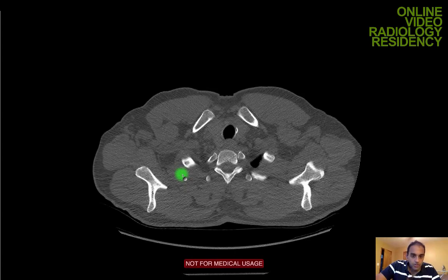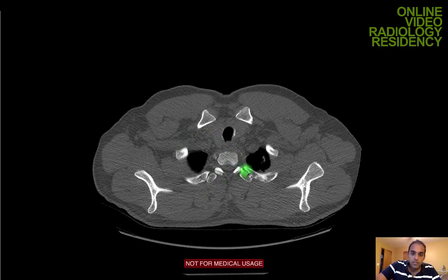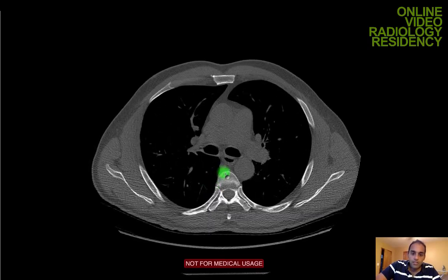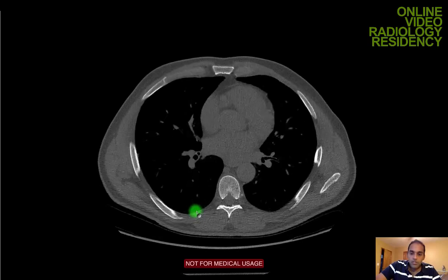And you can also assess the bones on a nice thin section axial view. I usually look at both the scapula, the clavicles, look at the ribs, and then looking at the thoracic spine vertebral bodies in the axial plane. Looking for basically any focal lesions, looking for any healed rib fractures or acute rib fractures in the setting of trauma, looking at the marrow for any expansion.